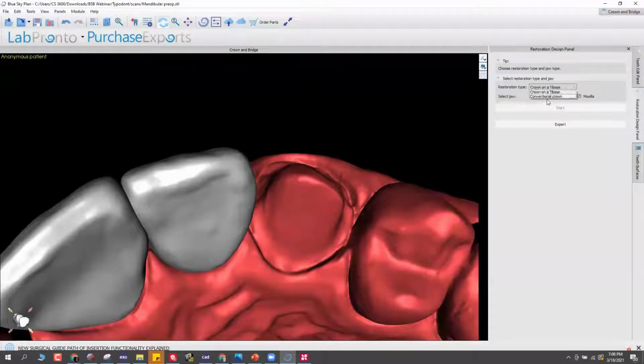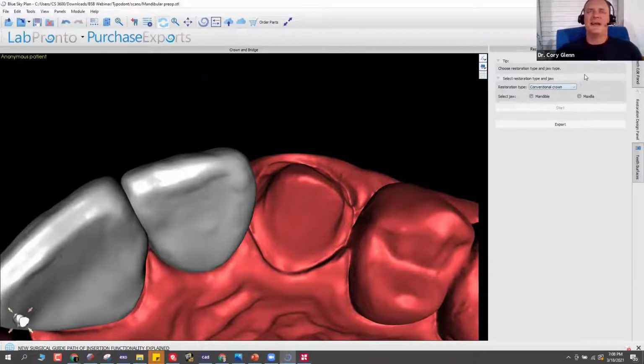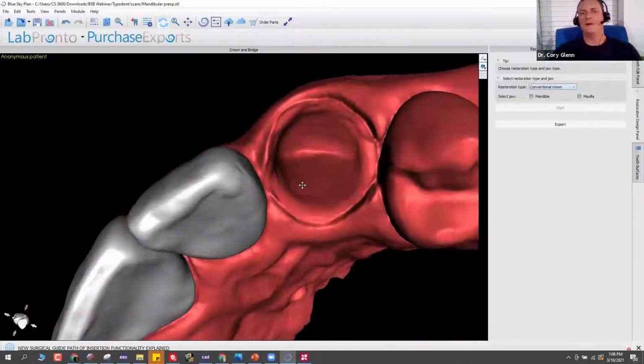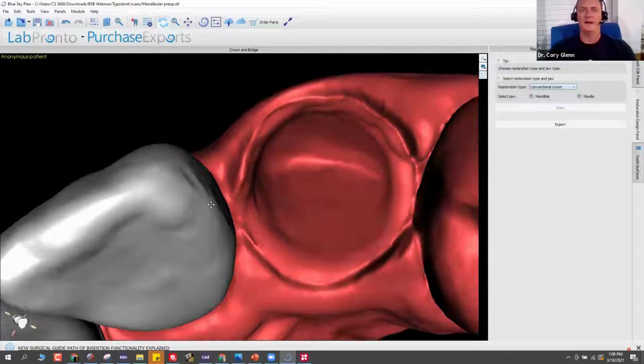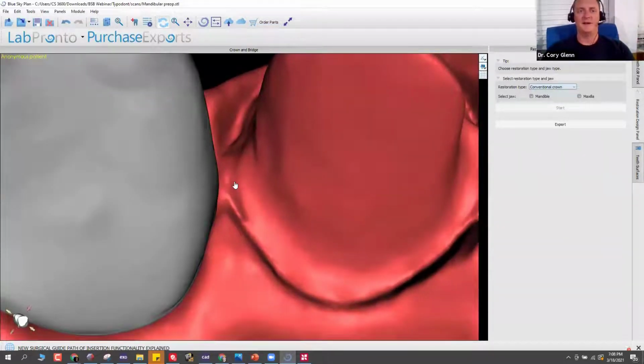Okay. Can you design veneers in Blue Sky Bio? See, that's a hesitant yes, because it's not optimized right now. If you just do this same workflow that I'm doing, the software is optimized for crowns right now. And things like an inlay or a veneer don't follow a routine margin with 360-degree coverage. So it's going to throw it haywire and you'll not get a good margin. The proposal will be all off. Now, with that said, we are creating that in upcoming builds. It's just a matter of time and we'll have that available.